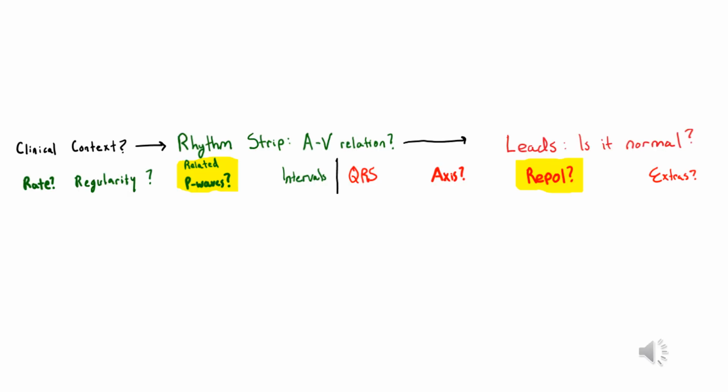Let's go back to the basic ECG approach at the top header of your ECG sheet. So we're scanning along the rhythm strip and we notice a break in R wave regularity, a gap. One way to approach the rhythm problem is to determine what's inside the gap. We'll address this on the next slide.